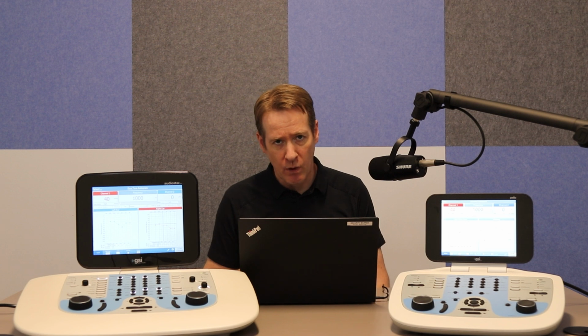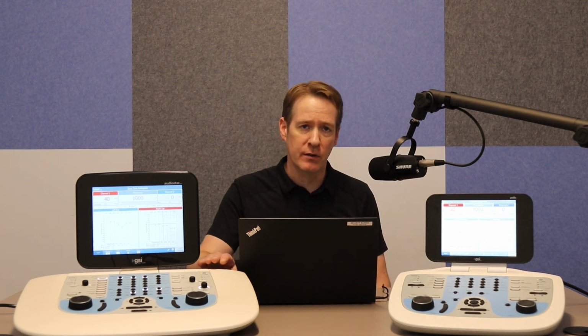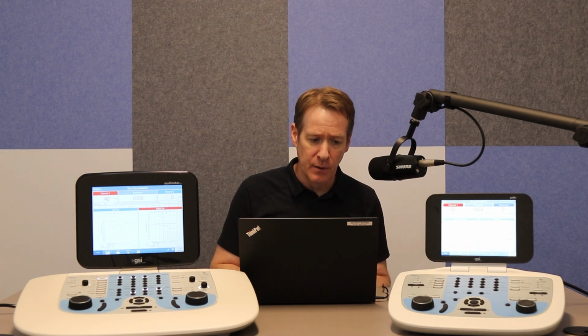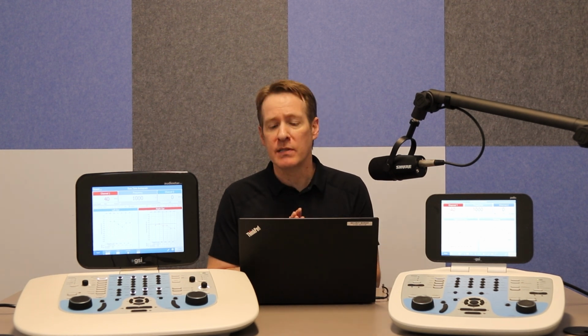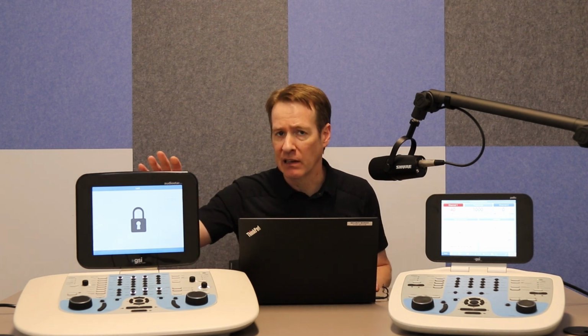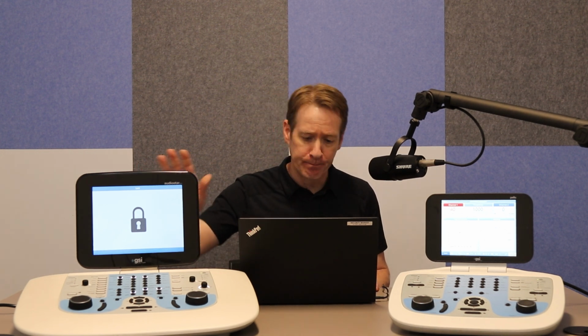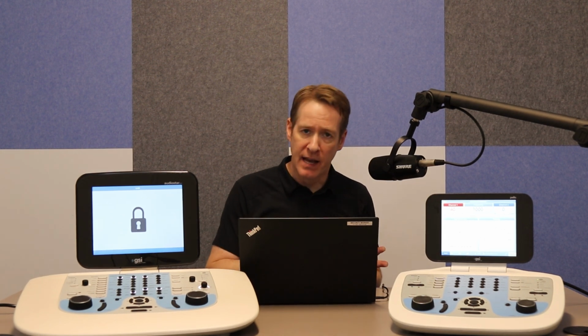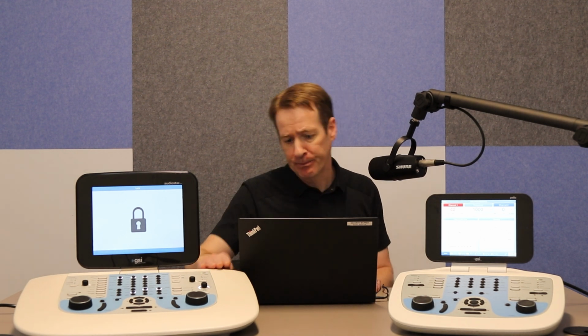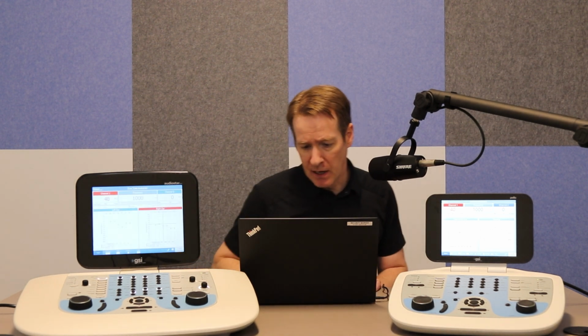So step number one is I'm going to open up the configuration application that came with the AudioStar Pro, and the very first thing I want to do is hit upload. What this is going to do is take all of the settings that are in the AudioStar Pro, and you might see a little lock screen come up when this goes on. It's going to pull that into the software application that allows me to make some changes and then send my changes back down as the default settings on the device. So it should be just finishing up here.